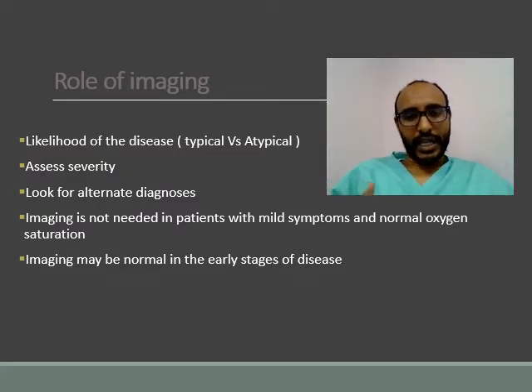Also we need to remember that imaging could be normal in the initial stages of the disease. If the disease is only two or three days old, you expect the X-ray may be normal, and the CT scan may be normal.